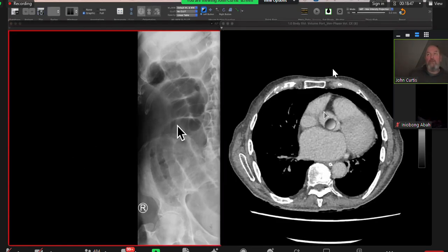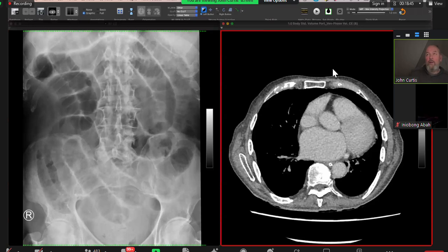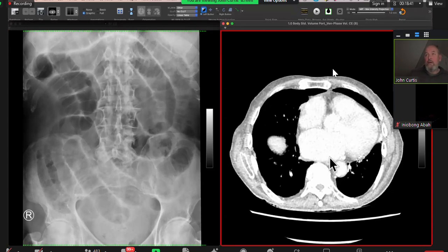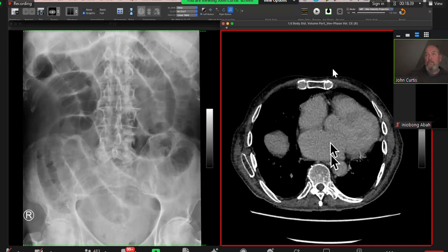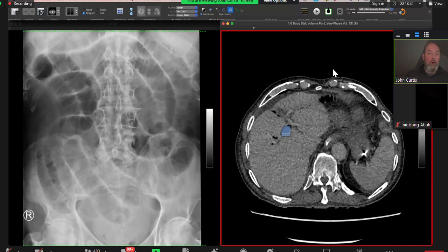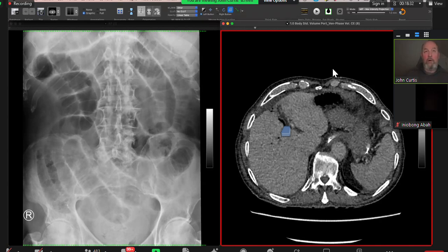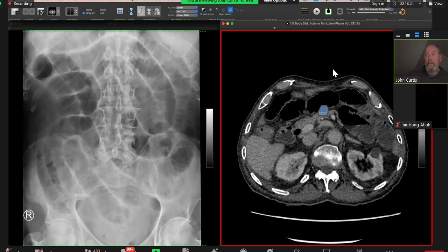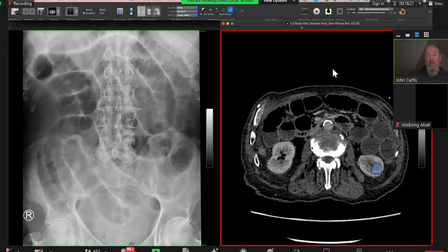And as you rightly say, you're looking for a gallstone ileus because you can see gas in the biliary tree. But don't forget, gas in the biliary tree as you get older could be more common anyway for other reasons, such as a lax sphincter of Oddi. And there was no gallstone ileus here. So I looked for a gallstone ileus, I couldn't see one.